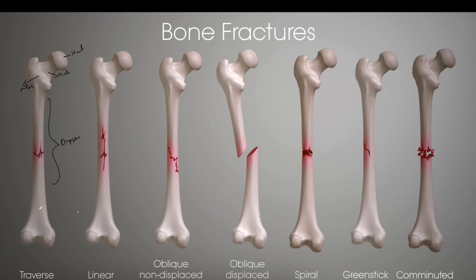When we are interpreting a fracture on an X-ray, we have to say whether it is the proximal part or distal part, and in the proximal part there are different parts. Based on that we convey the fracture interpretation. In a transverse fracture, what can we observe? The line will be horizontal like this. That horizontal fracture line is known as a transverse fracture.